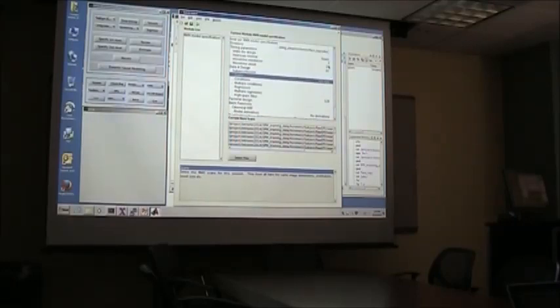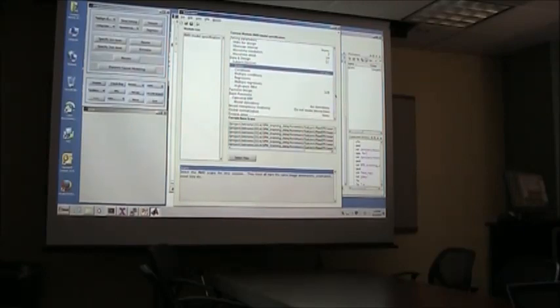And what you then do to set up your model, you can set them up one by one, meaning each and every condition that you have can be set up separately. There is a way in SPM to do that all at once, which I highly recommend, and I also put that in this little Word file that accompanies the manual.